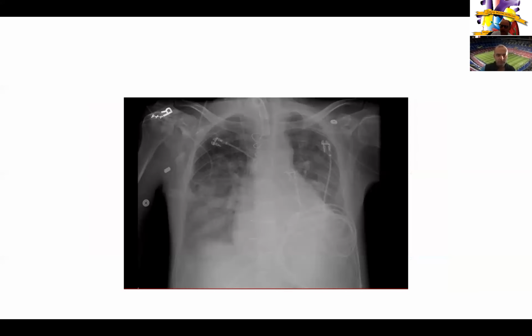We get a chest X-ray. Here's the chest X-ray. Yeah, so you can see here it's a frontal chest X-ray. You can see his prior sternotomy wires, so the patient has had prior open heart surgery. You can see what looks like a trachea here. He's intubated. And the other things to note is he has pulmonary edema bilaterally and enlarged cardiac borders. So probably he has heart failure and then some mild pleural effusions at the bottom of both the left and right side. As usual, again, this is a guy with suspected endocarditis and prior valve surgery.